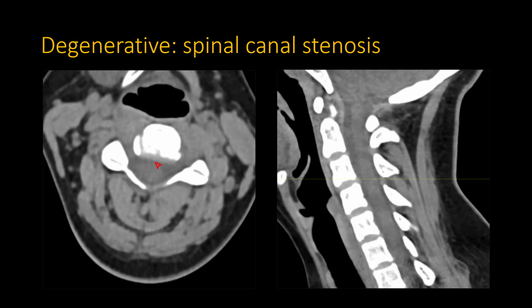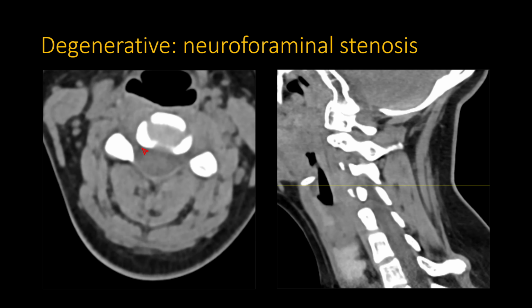Now, some people actually do measurements of the canal diameter, or they measure the canal centrally and laterally, etc. I think that's excessive, but again, go with whatever is common practice at your institution. I typically just do a subjective assessment as I described for the degree of spinal canal stenosis. Finally, you talk about the degree of neuroforaminal stenosis.